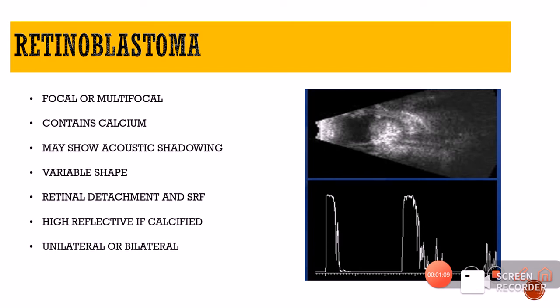Morphologically, retinoblastoma could be focal or multifocal, but what is important is the presence of calcium deposits in the retinoblastoma. Because of the calcium deposit and the ability of calcium to absorb most of the sound waves, it is going to cause this acoustic shadowing behind, right?